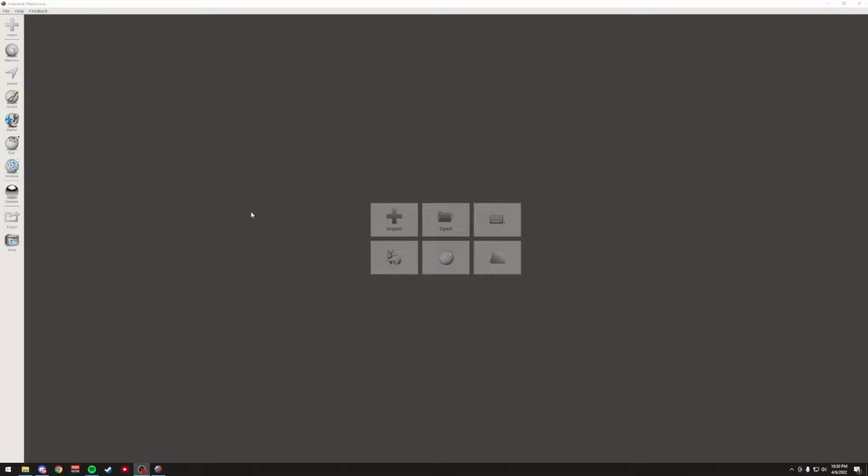And so the workaround the lab was using is basically to just create a traditional crown and bridge die model, 3D print it. That way they can check contacts, things like that on the models before sending us things back. But they were having a tough time with the scans that were sent back from the people who were making the custom abutments for us, where they just couldn't get it to print. They were having problems using 3Shape to get it to print out there.